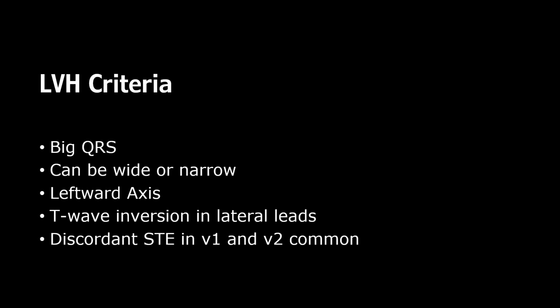And because you have that discordant relationship between the QRS and the T-wave, it's very common in all ECG patterns where you have discordance present that the ST segment will often deviate away from the isoelectric line with the T-wave. That's very common. So in a downward QRS and an upward T-wave, you're going to have some ST elevation. And that's what you see in LVH. Your QRSs are almost always down, V1, V2, V3. Your T-waves are up.